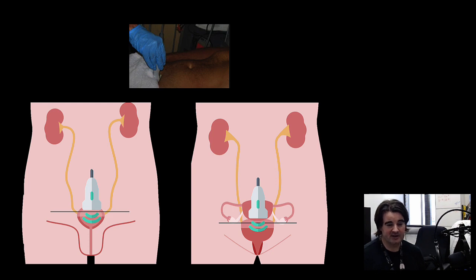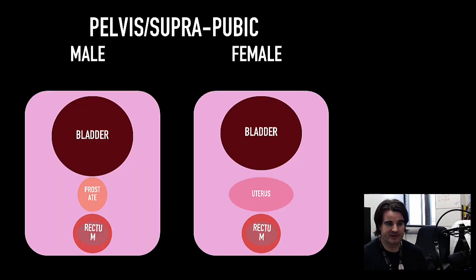However, the bladder is generally the first structure you're going to see here, permitting the bladder actually has urine in it. Otherwise, you actually might see ascites, which we'll come to some more later on in this talk. So of course, the anatomy does in fact look different. These are simple graphical examples of imaging bladders in the transverse plane. But of course, this presumes that the bladder does have some urine in it.